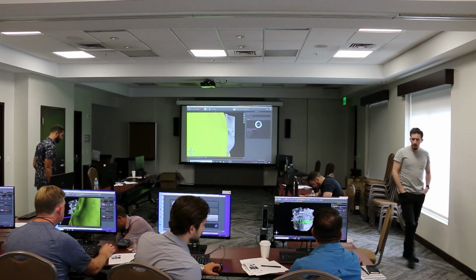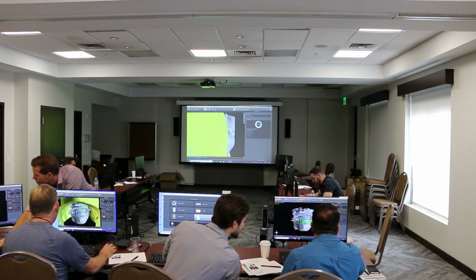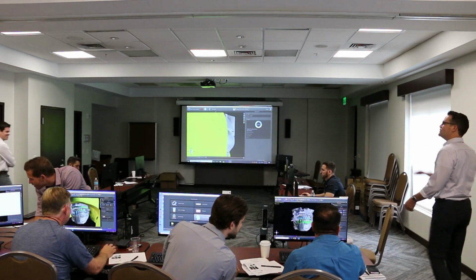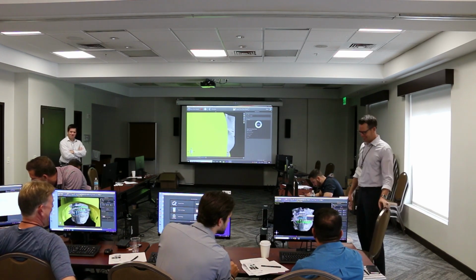Nice. Very good. And now there's a little drop down menu. This right here? Yes. There's a little drop down on the bottom there. Expand it. This one here? Yeah.